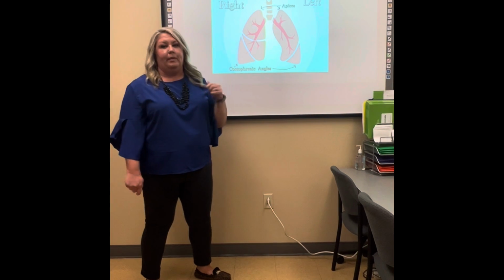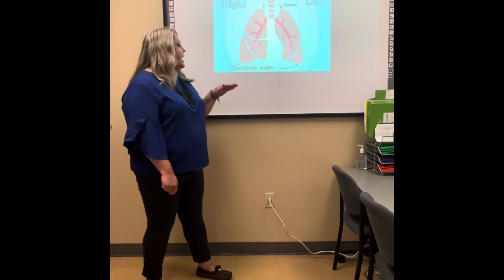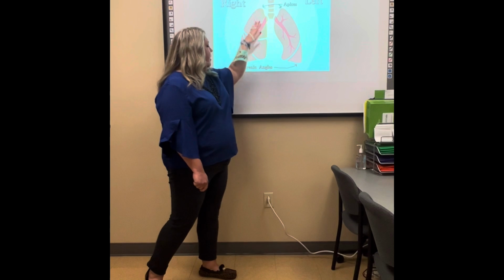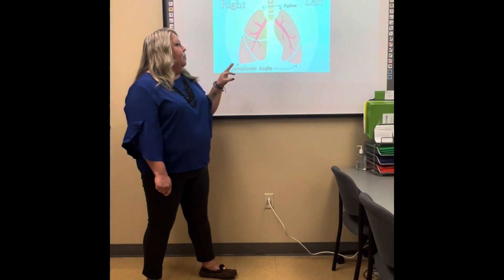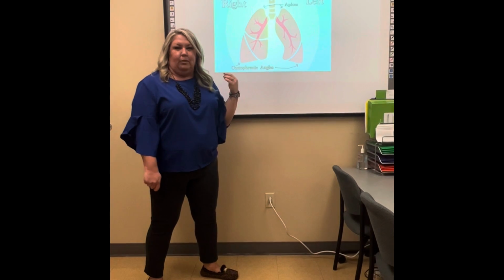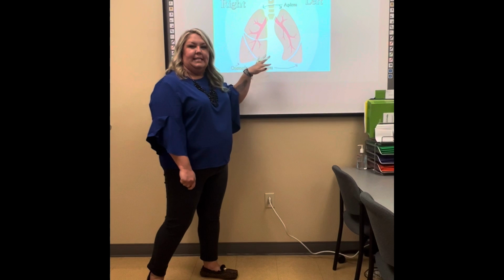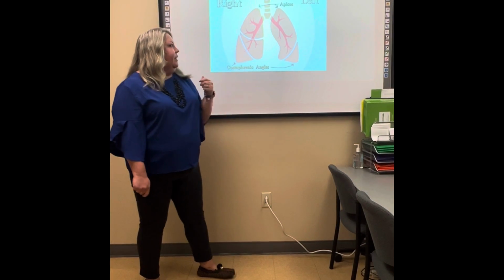The most important thing that we probably need to remember when we're imaging the lungs in chest radiography is our different parts of the lungs. We have our apices, which are the top, and then the costophrenic angles that are at the base or at the bottom. We'll go over it in image evaluation, but it's really important that we know where both of these are so that we can make sure we have them on our chest radiographs. So if we'll go to the next image.